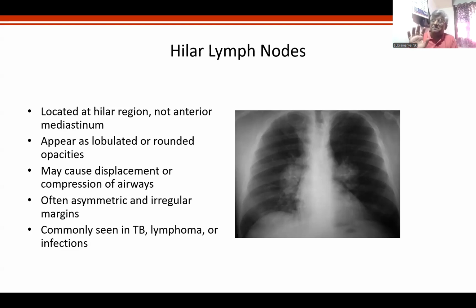That means to say, there is a pneumonia. It cannot be left untreated or without progress or resolve till a lymph node enlarges in size. It should be a slowly progressive pneumonia for you to identify lymphadenopathy.